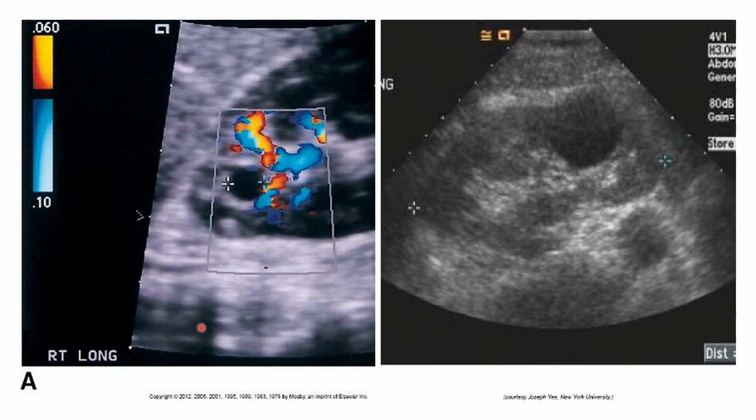So here's what they're going to look like. Here we have the kidney. Now the cortex of this kidney looks a little dark because I think we've got a rib shadow here, and we've also turned on the color Doppler, which tends to darken the grayscale a little bit. But if you look here in the box, you can see there's normal renal cortex here, and we have this anechoic circular structure with posterior acoustic enhancement that is a cyst in the superior pole.